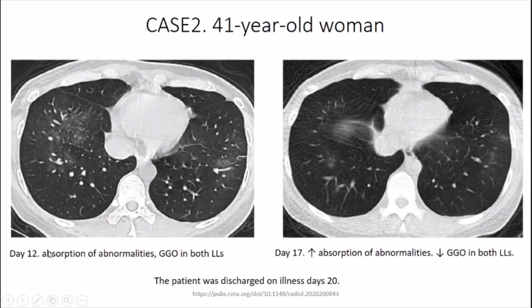And on day 12, the abnormalities are becoming more absorbed, and on day 17, almost a clear lung with residual ground glass opacities.